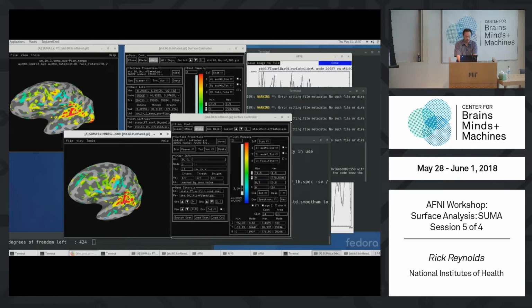If we click in the Y there, coordinates 43, 31, 5 versus 41, 9, negative 22. The coordinates are drastically different. These coordinates are in MNI space. And there you go, piece of cake. No effort almost at all. So that's the power of having those icosahedron surfaces. You can just leap across subjects as long as they've run through that same mapping.